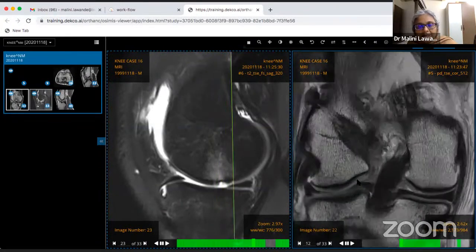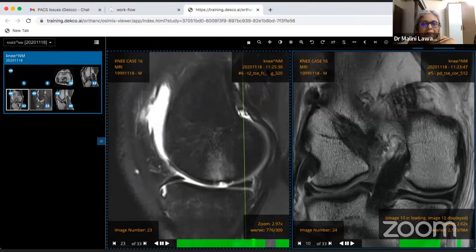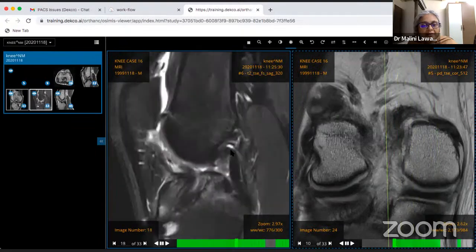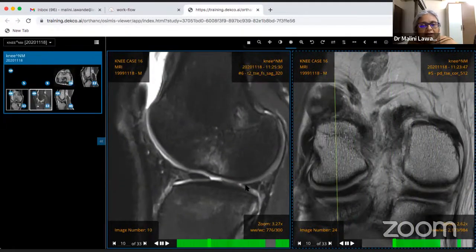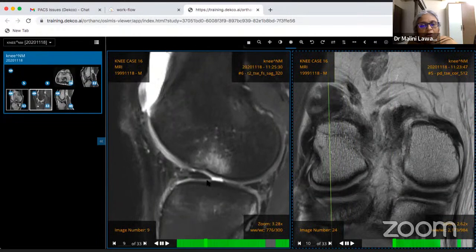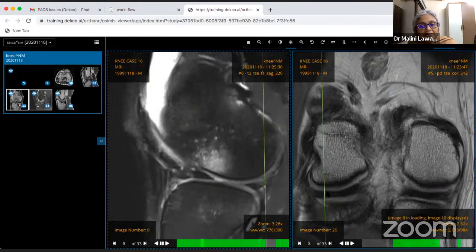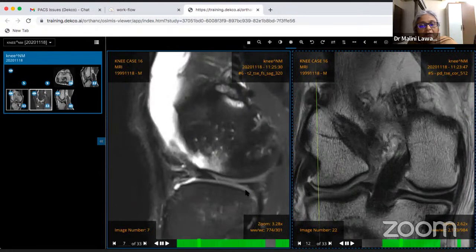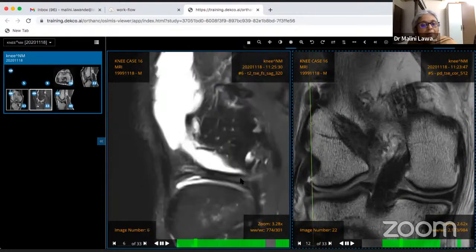We look at the meniscus, and again, look at this lateral meniscus. This is normal medial meniscus. This is lateral meniscus, and you're wondering, is this a tear out here? So what do we look at? The lateral meniscus, we come back here. Can you see this lateral meniscus posterior horn looks smaller than the anterior horn here? You will all agree. But this section where on coronal images I was worried, can this be a tear? This bit here. When I look at it on these images, it's not bright like fluid. So that tells me this is likely only a post-operative change.